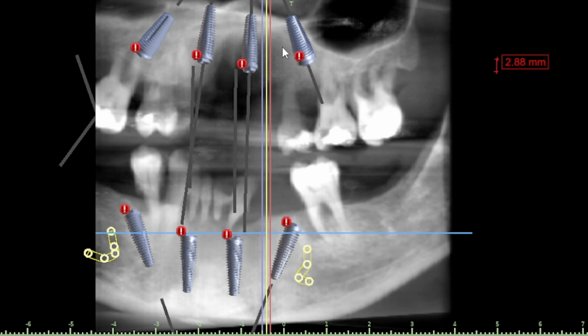Now, when we are planning from here, we need to look, our last tooth is going to be this one here. And that's fine because this lady's not smiling that far back. But if we could see that our implant's only going to come out in this position and the patient is smiling more widely than that, then we need to look at other implants, and it's usually something called a pterygoid implant, which goes really far back. So all of these things are taken into account.